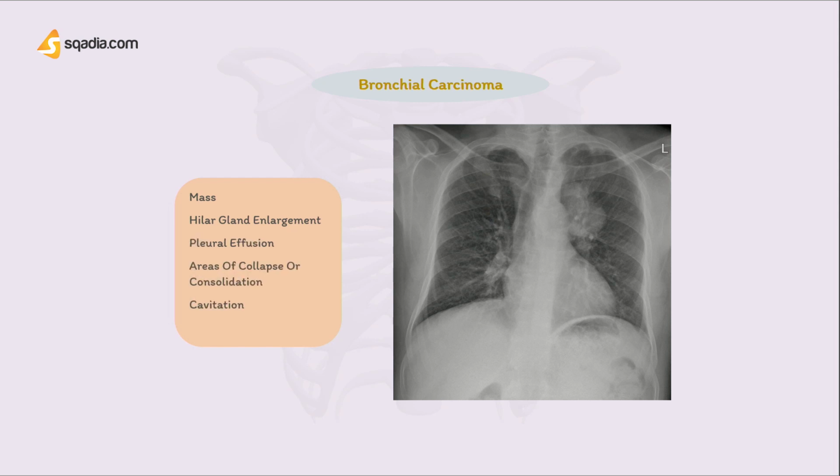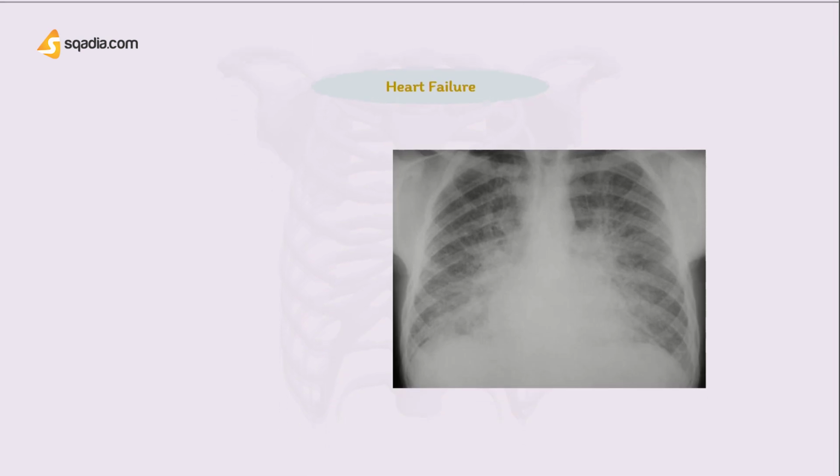Cavitation can be found in 15% of patients, since squamous cell carcinomas frequently cavitate. They may also see metastases. Moving on to heart failure.